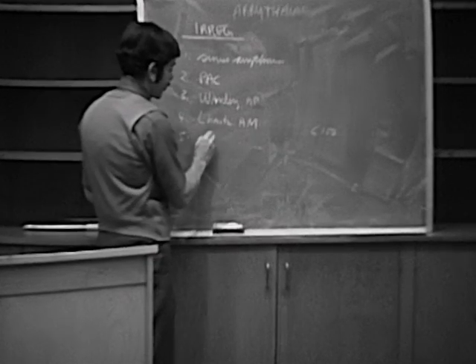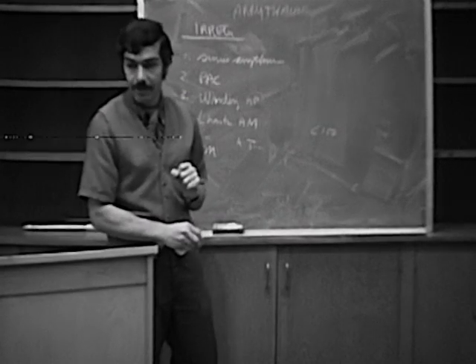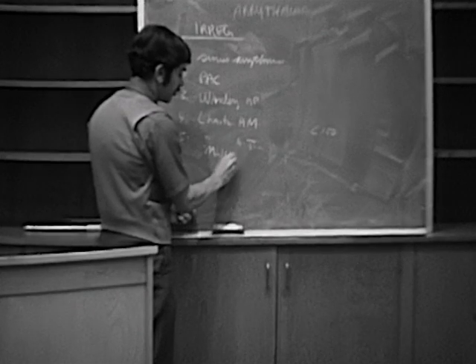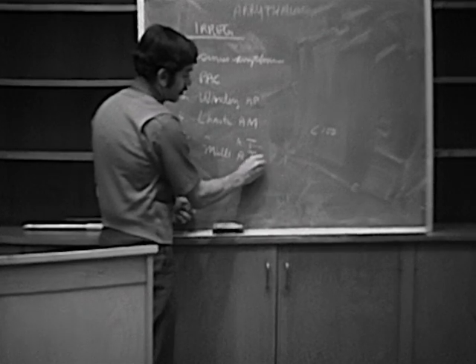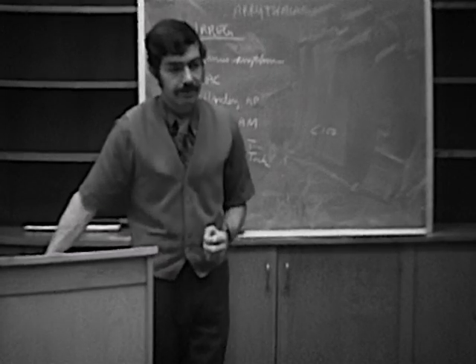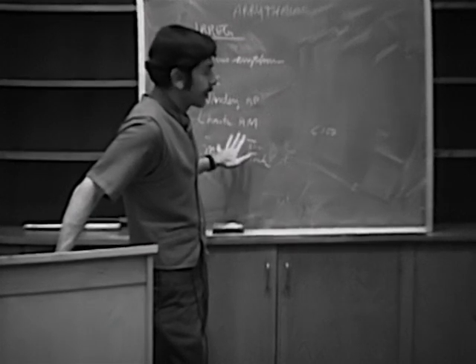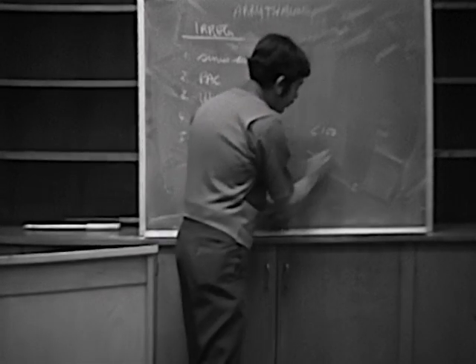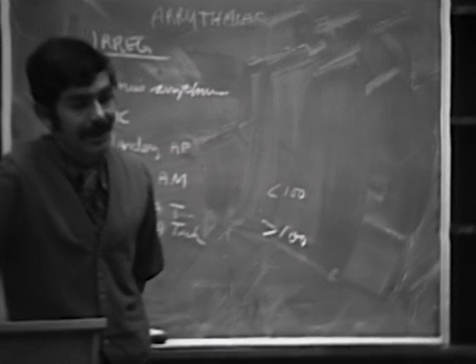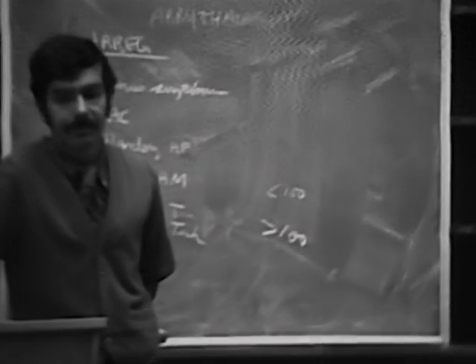Right? So you have chaotic atrial tachycardia, which you may have heard of, multifocal atrial tachycardia. You've heard of that term. Multifocal atrial tach. And this is the same thing as chaotic atrial mechanism, except that you have so much atrial ectopic activity that your rate is greater than 100. You wind up with a rate of greater than 100 because of all of this ectopic atrial activity. And you have very bizarre-looking P waves on these tracings.